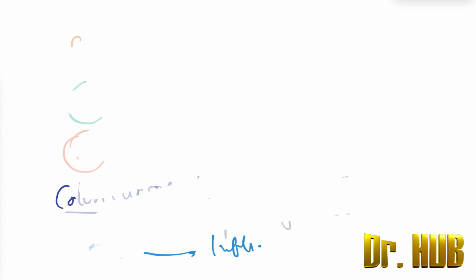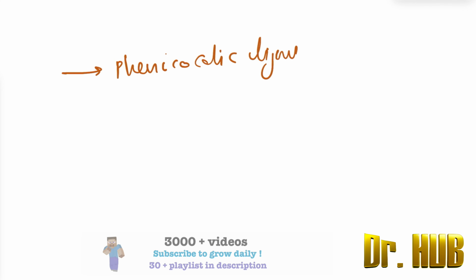And what is this extension of inflammation? There is extension of inflammation to the phrenicocolic ligament. And what is it through? It is via the transverse mesocolon.